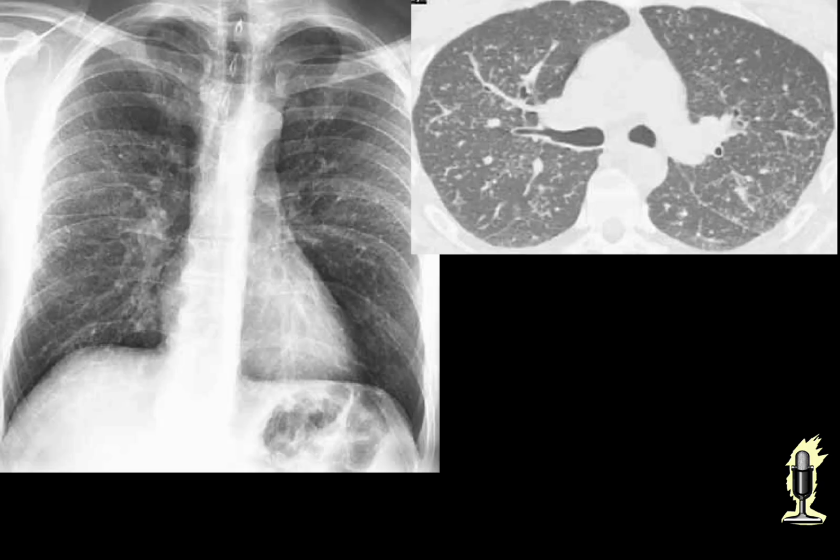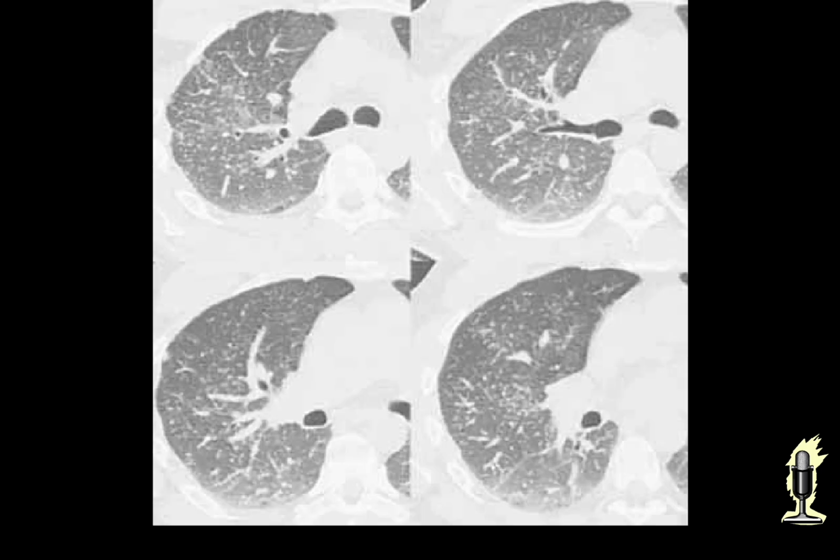Note the centri-acinar airway nodules, primarily involving the mid-lungs in this patient with farmer's lung. In contrast to the profusion within the lobule, the periphery of the lobule is relatively spared.